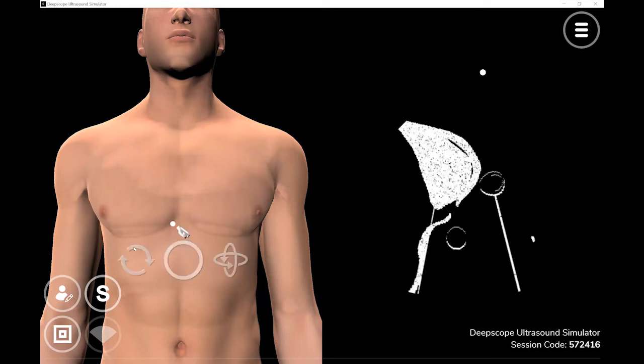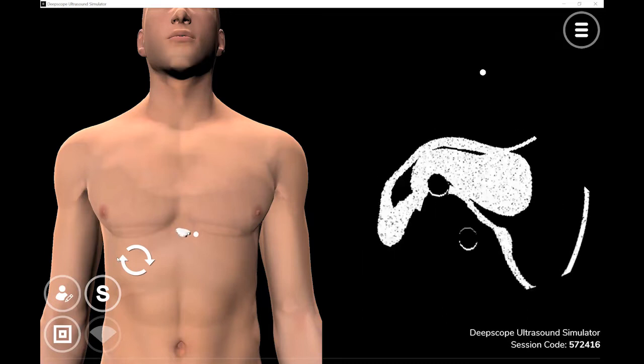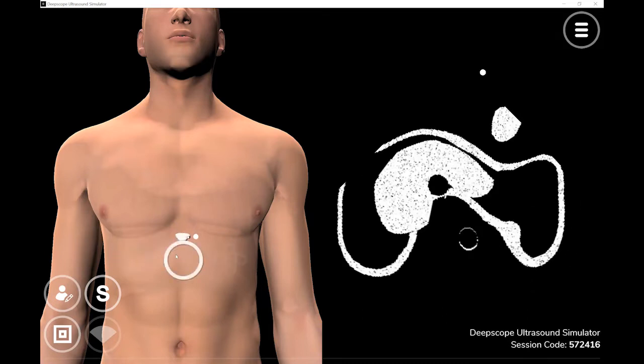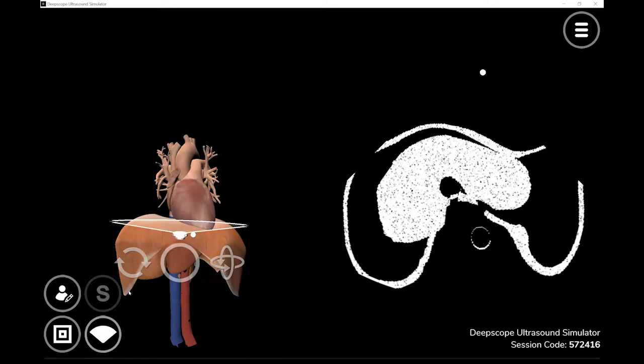Now I want to have your indicator rotating to about 3 o'clock as a start. We want to make sure your probe is near the center of the xiphoid area. Right now, because the beam is shining perpendicular to the chest, all we are seeing is the liver, the IVC, the aorta, and I guess the diaphragm that is shown here. You can show the learner what the cut is like. Here's the beam. I can take the skin out, so I know that I'm only seeing the organ.